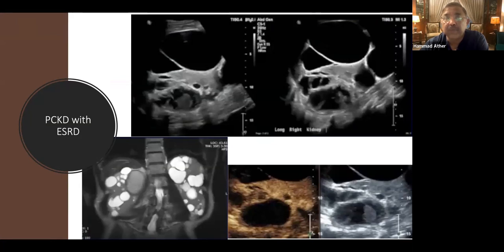If you have blood and debris, it would not enhance. If you have a vascular structure, a nodule, or a thick septa with some microcirculation, this would enhance on an ultrasound, whereas an MR, a good quality ultrasound, is unable to define this lesion. A contrast-enhanced ultrasound really clarifies the situation. What we see inside this cystic mass is basically blood and not a nodule or a tumor.